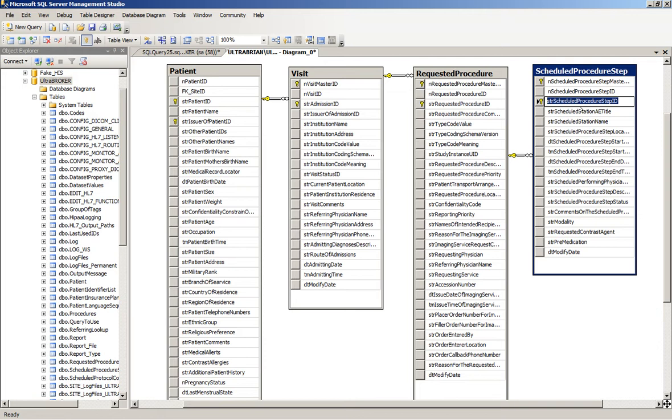And again, at minimum, we must have these tables populated. If you forget which fields must have a value, whether it's the STR admission ID or the NVisit ID or the issuer of admission ID, you can always just go and look at those keys in the database using Management Studio, which you see I have here. But at this point, we know what those fields are.